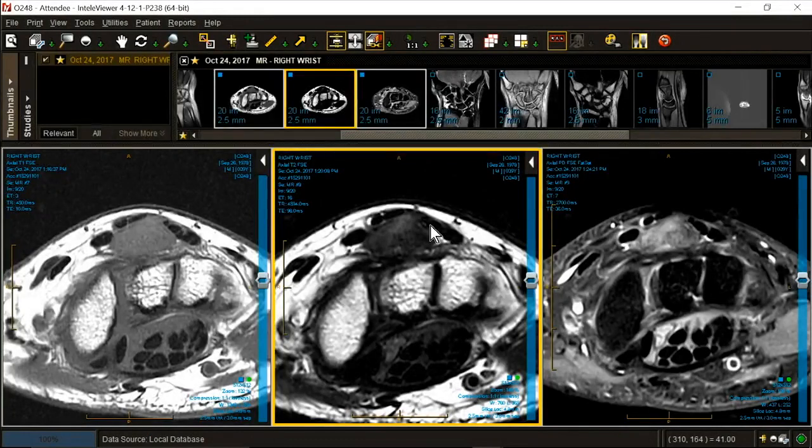So then we go to signal. It's not black signal, lossless black signal like air, like flow, like gas, like metal. Those are out. So what are we left with? Fibrous tissue, blood, siderosis. So she hasn't had an acute bout of trauma. There's not a lot of swelling present. So a hematoma is a pretty unlikely consideration. There's also not a lot of methemoglobin staining. So that really leaves us with only one choice.